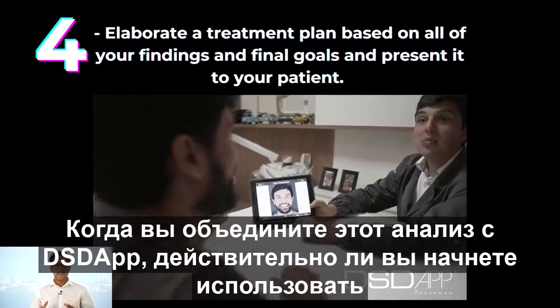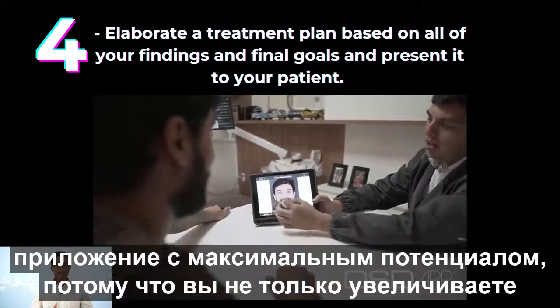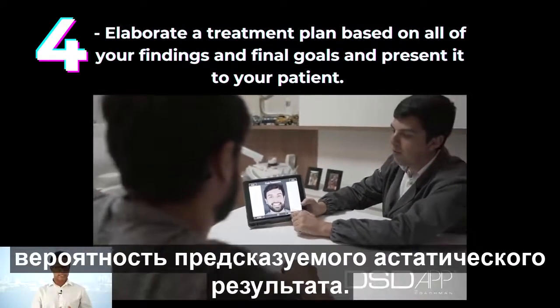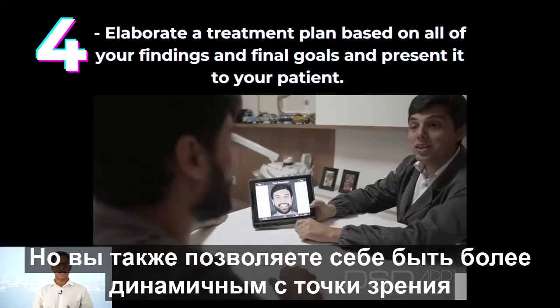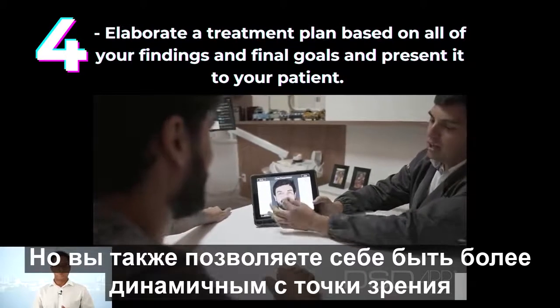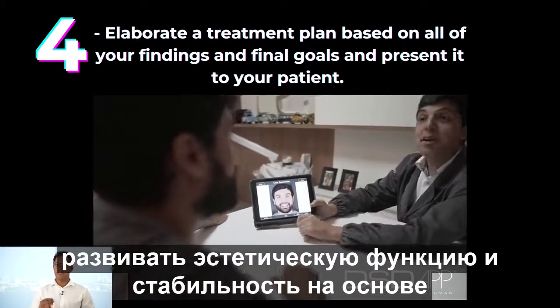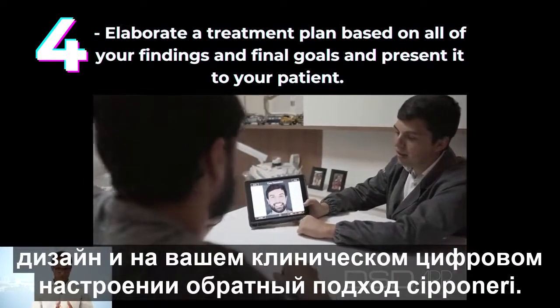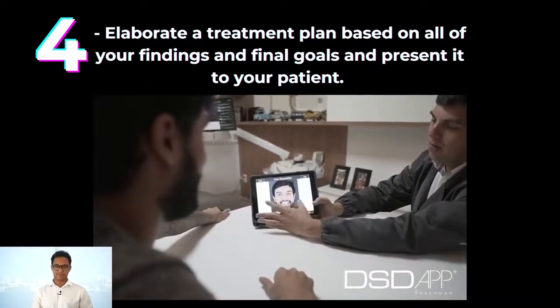When you combine these analyses with DSD app, you truly begin to use the app to its maximum potential, because you're not only increasing the likelihood of predictable aesthetic results, but you are also allowing yourself to be more dynamic in terms of involving aesthetics, function, and stability based on the facially driven design and on your clinical, digital, multidisciplinary reverse approach.